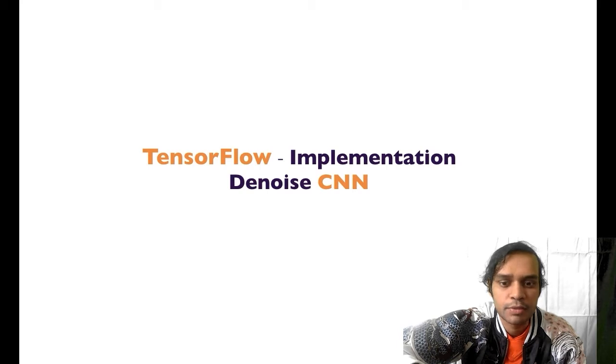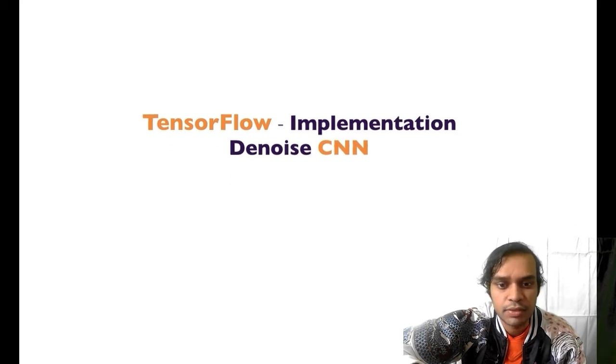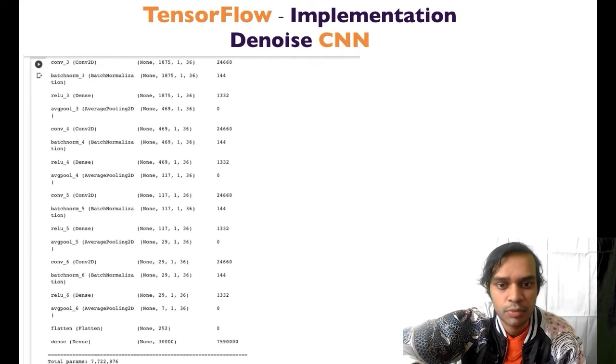Hey there, my name is Vichas Muthumani and I will be talking through the implementation of the same denoising model, but this one was built using TensorFlow API. And I will be showing you the results of my training, and I will also be showing the output results, right? How good it is in denoising the signal. And finally, I will be showing a table that shows how training on MATLAB is compared to training with the TensorFlow API.